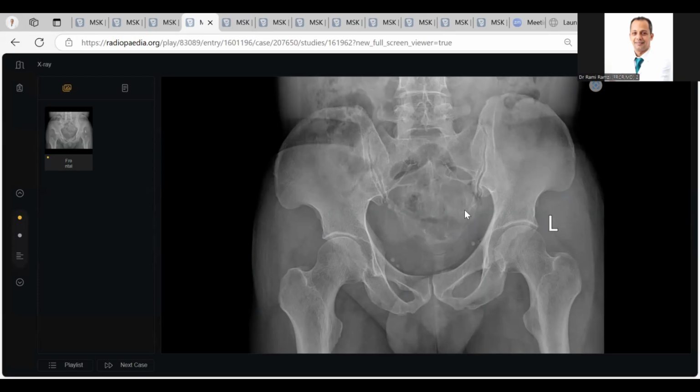Increased sclerosis. Tell me anything. Increased sclerosis, sclerotic lesion, and then describe. There is ill-defined cortex here. I suspect there is a large mass here. I think you told me there is something here at the beginning, but you don't know where the origin is. No, this is the lesion at all. The whole of this is the lesion, and the center is here, a sacral lesion.